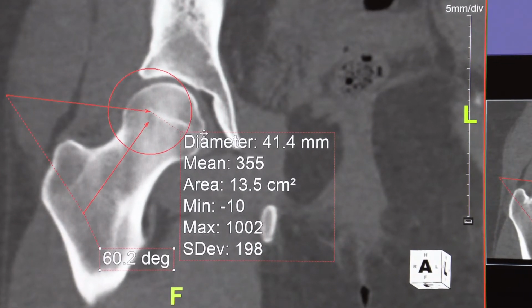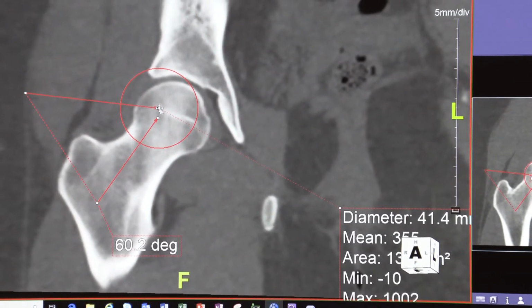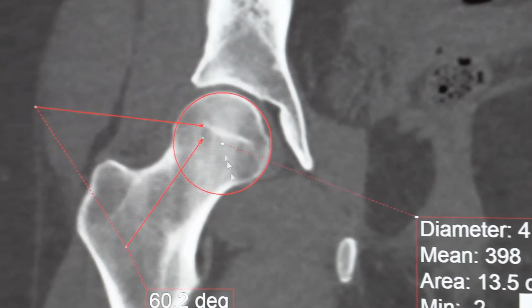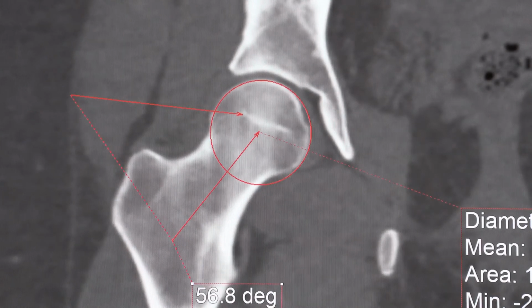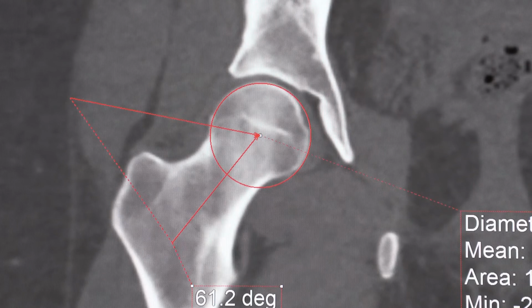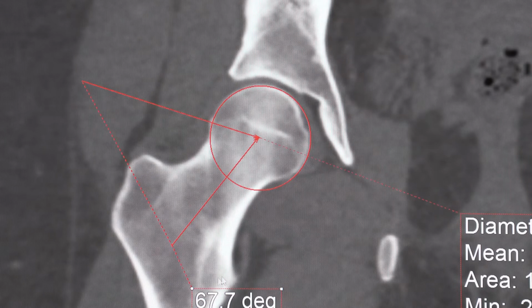And I have to remove all of this. And let's move the circle right here like that. So now this is a circle and you have to adjust the lines. This is in the center and this has to be adjusted like that. And you can bring this line. Now where do you exit? In this case, exiting right here about that, right? So at this point it's 67 degrees.